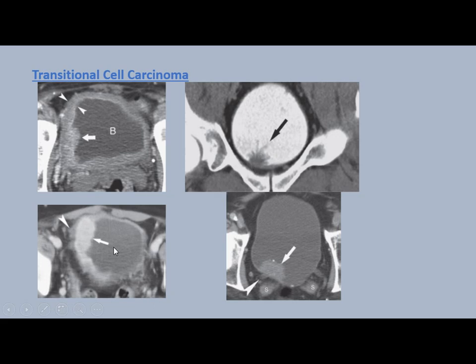The first one is not a native, it's a contrast CT. And the second one is a delayed phase CT. Or both of them with contrast. The first one is also with contrast. You can see the contrast in the vessels and the enhancement of the mass lesion. Yeah, not delayed. The second one is delayed. Okay, don't worry. Continue. This is after contrast, there is enhancement of the soft tissue.